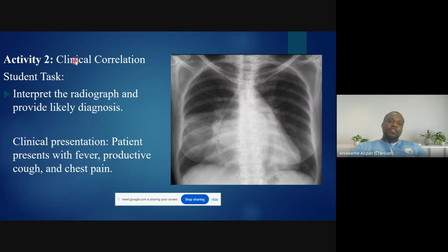So we are going to use some clinical history, because it's actually very important. Like I said, we are looking at images with radiolucencies and radio-opacities, and radiologists use this to give a diagnosis. So sometimes they need history: has there been any previous intervention? Is this patient on medication?